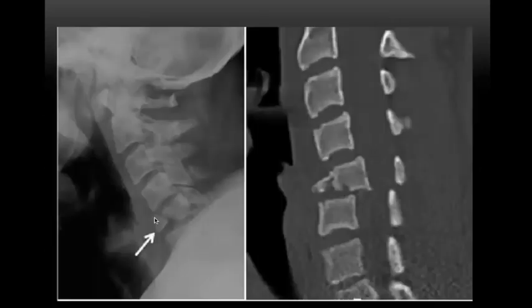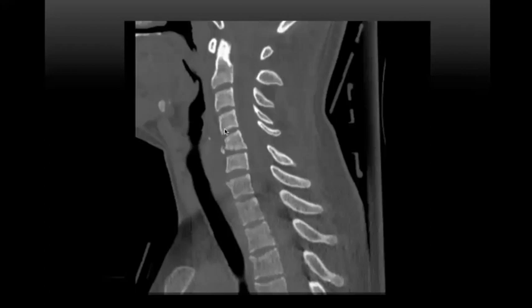All right. So again, this is a teardrop. You can see here, there's disruption here. Tiba-tiba ke sini, patutnya ke sini kan? So it goes all the way to the back and causing spinal canal compression. And yet you have this anterior vertebral body fragment anteriorly. So that's the flexion teardrop fracture. This is on CT. Again, similar small teardrop fracture there. And you have the widening of the spinous process at the back.